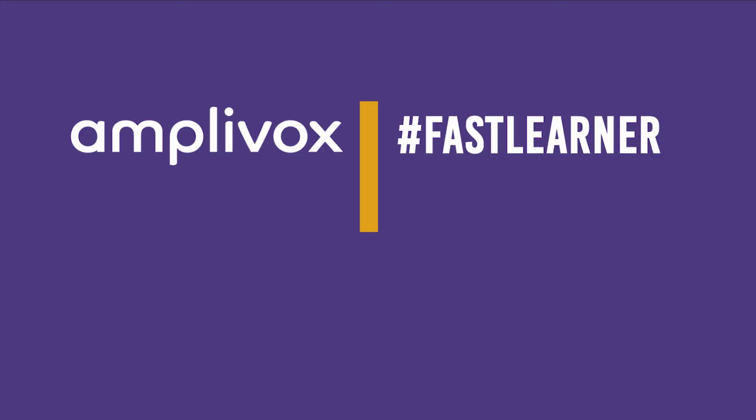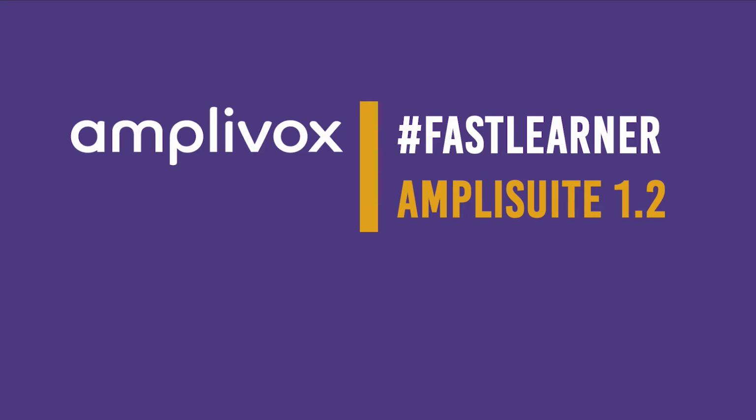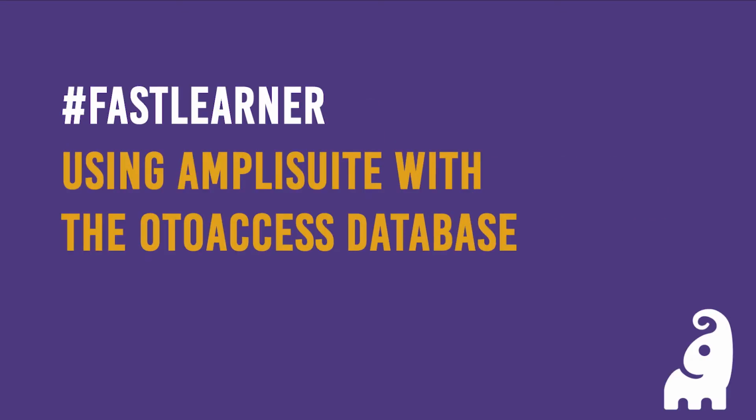Hello, in today's Fast Learner video, I will show you how to use Amplisuite 1.2 with the OtoAccess database.